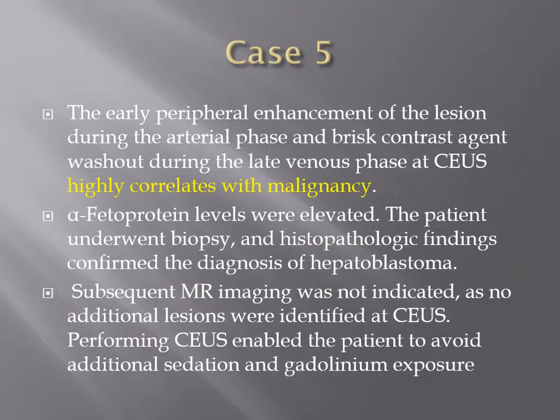So the sequence MRI was not indicated, and no additional imaging was required. Performing contrast ultrasound, as we said, also enabled the patient to avoid additional sedation and gadolinium exposure. So they just proceeded with the ultrasound biopsy, and that's it, with follow up later on, or further management.